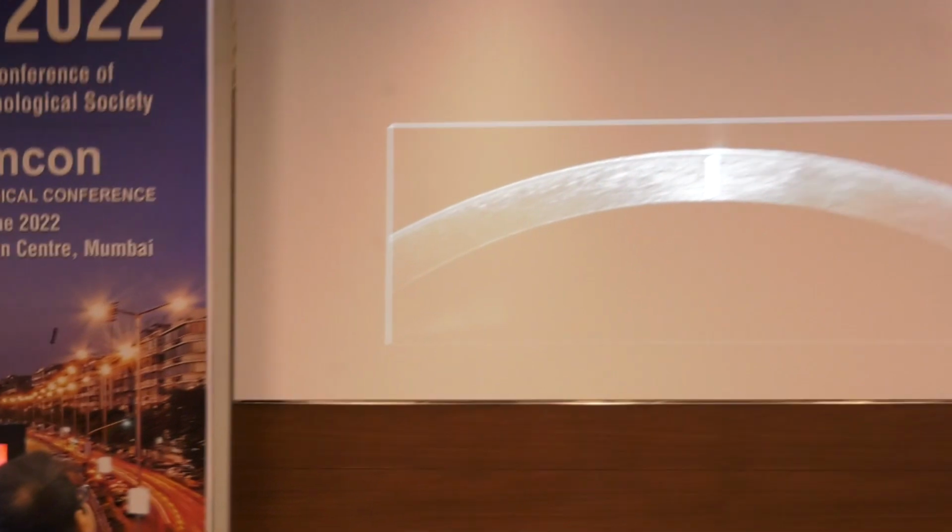Good morning, everyone. So I'll be talking on anterior segment OCT in refractive surgery. As we know, there are two basic types, that is the time domain and the spectral domain OCT. The use in laser vision correction is mainly in pre-op as well as post-operative. So I'll be discussing about it.